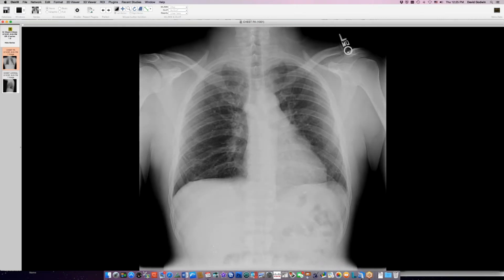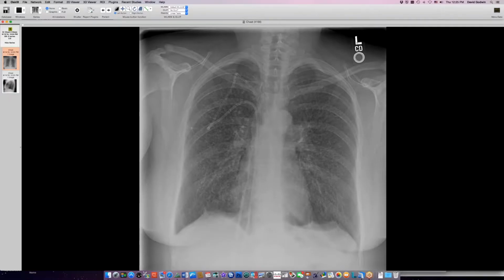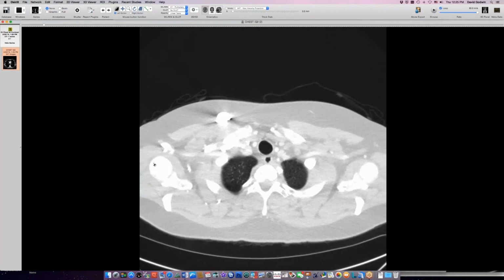Okay, so I wanted to show you this person with this, I think, sort of distinctive pattern of lung fibrosis. This is a woman, I think, at this point in her 30s, and she's been sick since her early 20s, and she got a biopsy back 10 years ago. And let me show you her CT scan first and see if you can predict what the biopsy showed.